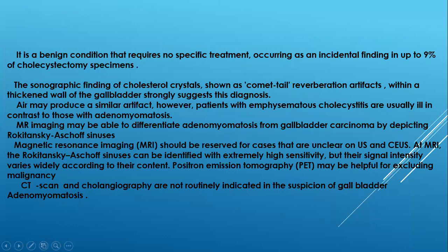It's a benign condition that requires no specific treatment, occurring as an incidental finding in up to 9% of cholecystectomy specimens. Sonography finding of cholesterol crystals showing comet-tail reverberation artifact within the thick wall of the gallbladder strongly suggests the diagnosis. Air may produce a similar artifact. Patients with emphysematous cholecystitis are usually ill, in contrast to those with adenomyomatosis.